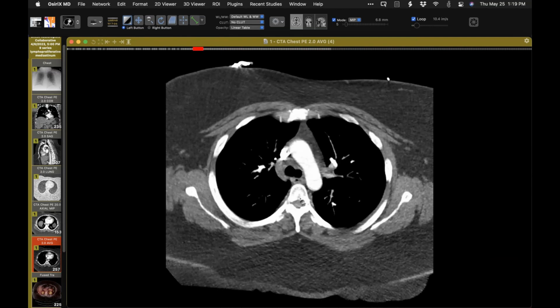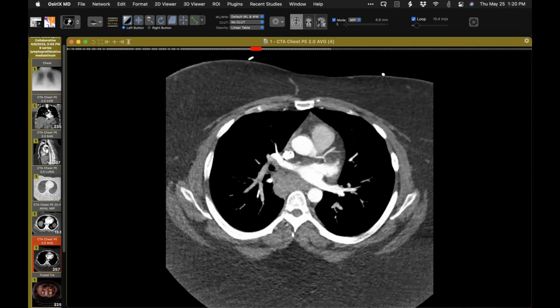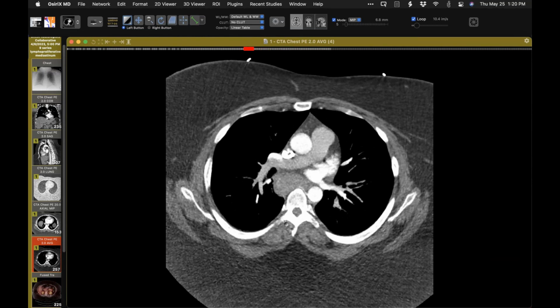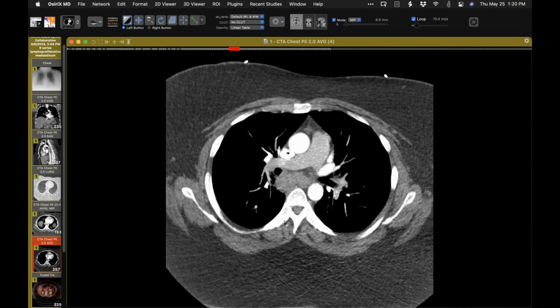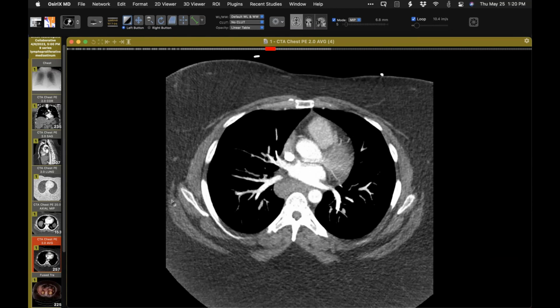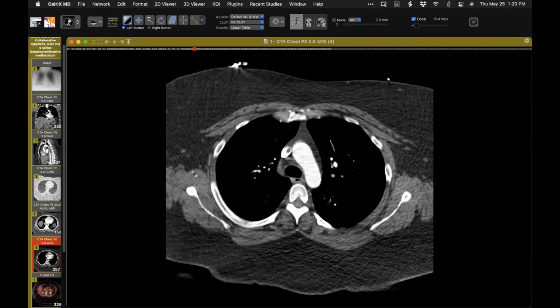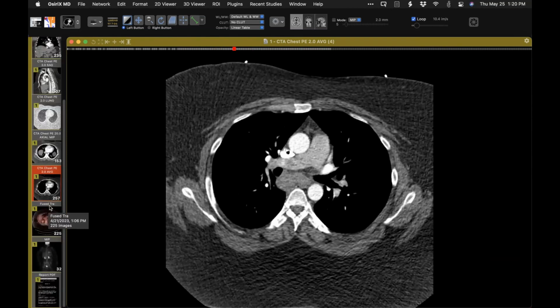not distended. Okay, well, with the vessel, you'd wonder about Castleman disease. Kind of vascular. Not vascular enough for, say, a paraganglioma. Yeah, they're usually a lot more hypervascular than that. They're much brighter, even relatively early in the sequence. It's really smooth, whatever it is. Lymphoma, maybe, but yeah, I like Castleman disease given the vessel and the sort of confluent mass.